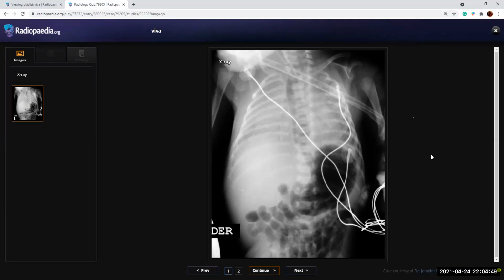Then with regard to the lungs, and with the history of a preterm, my primary differential would go in favor of hyaline membrane disease. So I would convey my findings to the concerned pediatrician. Okay. So what you said is okay. You said about the endotracheal tube. Is there any other abnormality in the region of the mediastinum that you're seeing that you don't expect normally?